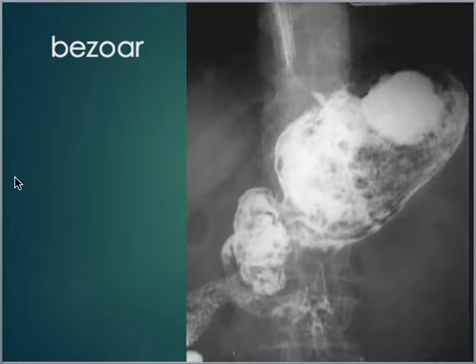This is a Bezoar. I don't know if any of you have ever heard of a Bezoar, but a Bezoar is a tightly packed, either undigested or partially digested material. A lot of times it's made up of maybe food fibers. Sometimes it's made up of hair and clothing fibers. I know you've probably heard people saying, oh, I ate my twin. Sometimes they can even have hair and teeth inside of them. A lot of people used to say that it was the twin that they absorbed.